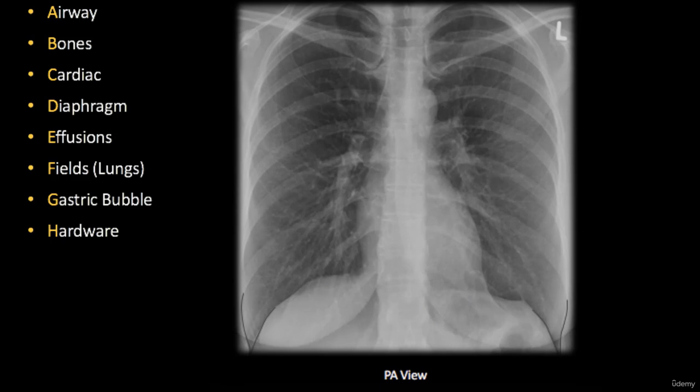Lateral to the dome of the diaphragm, between the diaphragm and the inner surface of the thoracic wall, you can see some angles, two recesses, the costodiaphragmatic recesses. Normally they are empty. We have a very thin film of pleural fluid here, and the lower parts of the lungs slide down here in deep inspiration. So normally we have nothing in them.